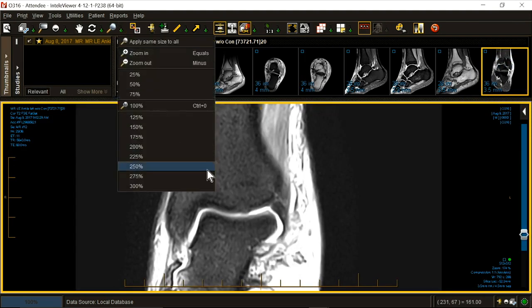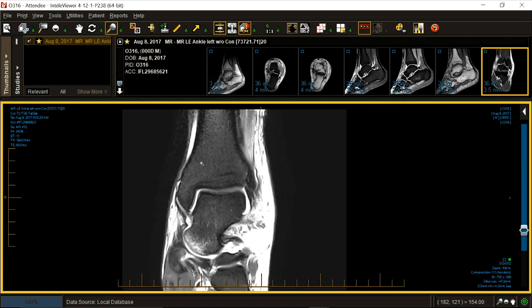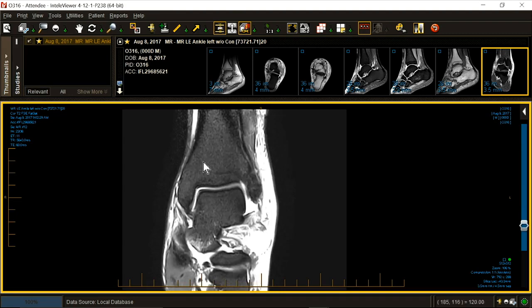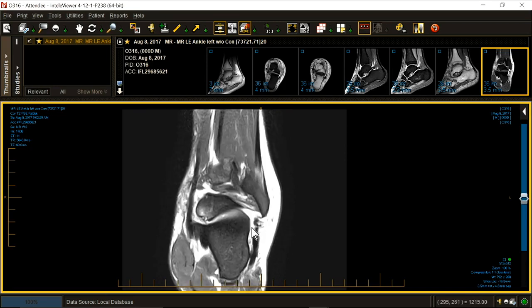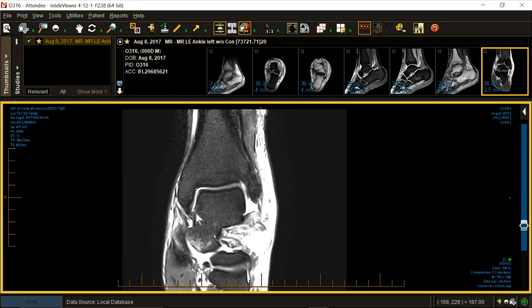Let's mag out. By the way, it's an inversion injury. Here's his calcaneofibular ligament. And let's just check out his deltoid for giggles. It's a little swollen. Some of the fibers have come detached. We don't care. That's a common secondary minor injury. It'll get better.